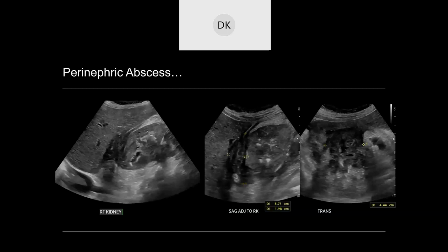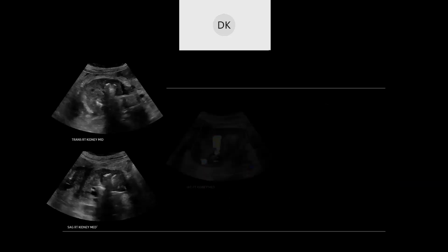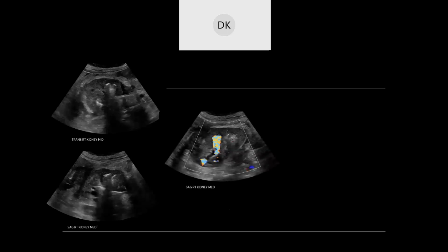And then if we look further, you can see these curvilinear and linear echogenic areas with dirty shadowing. So we have some gas there. And then one thing that you can do to increase the conspicuity of gas is add color Doppler, and you get twinkle artifact, which is definitely not specific for gas. As you know, you can see that with renal stones, but it usually has a bit more dramatic twinkling compared to just renal stones. So it can kind of outline the pathology a bit further.